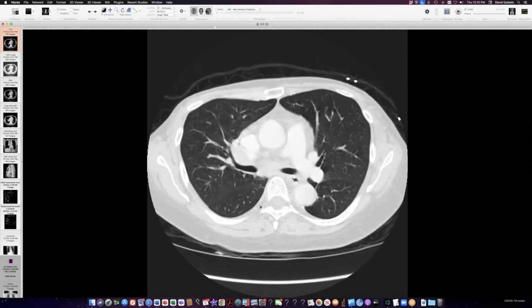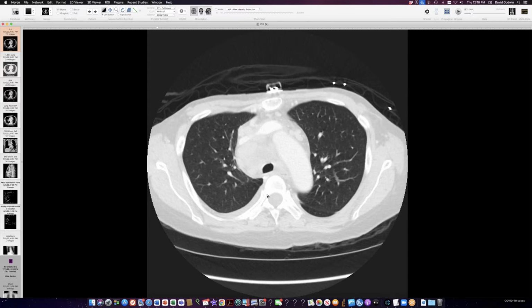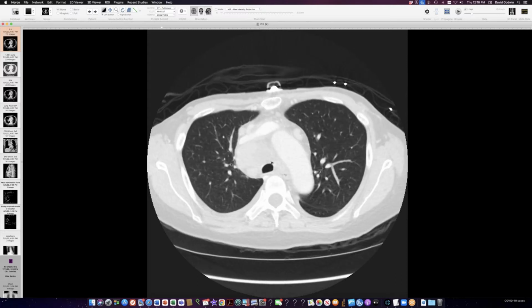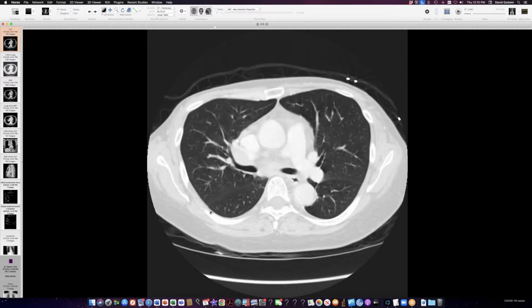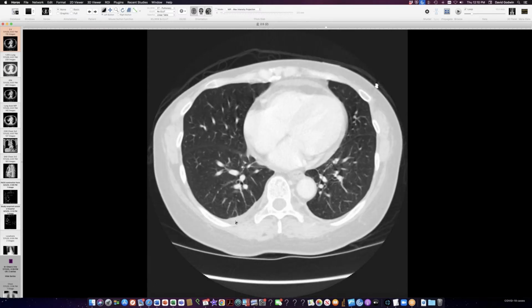Wow. Yeah. As is frequently the case with lymphoma, there's accompanying pleural effusion. When you get a lot of mediastinal lymphadenopathy, you get pleural effusion, probably just because the lymphatics are being obstructed by the central lymphadenopathy. It doesn't reflect that there is malignancy in the pleural space itself. So really a remarkable lymphoma presentation of PTLD.